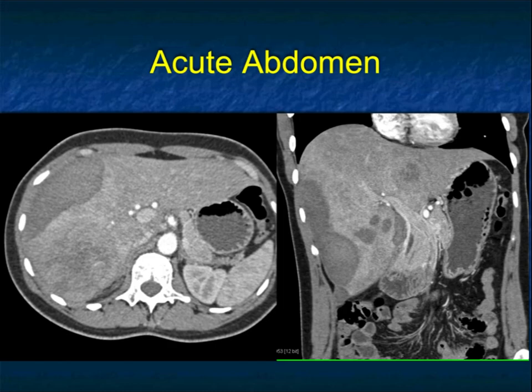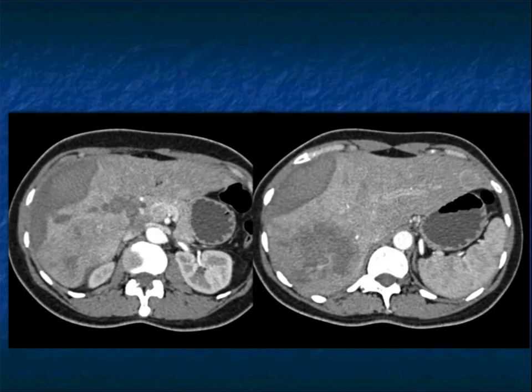Another example, large bleed, right lobe of liver. This is both acute, and I won't say chronic, but acute and subacute perhaps. Where's the primary tumor? They look like a number of lesions, including in the left lobe. Again, it's hard to define the border of the lesion in the right lobe because there was just so much blood present. Any portion of this could have bled, and then it's hard to define exactly where the bleeding site is.